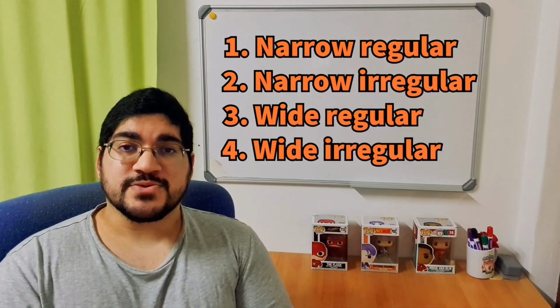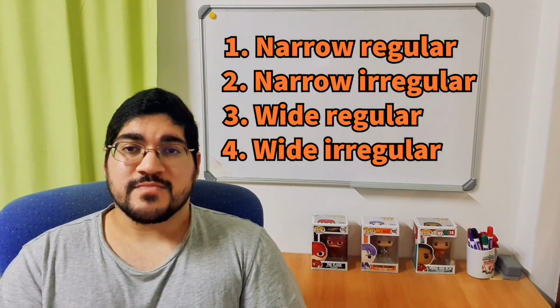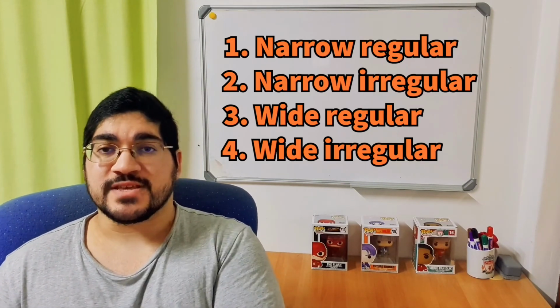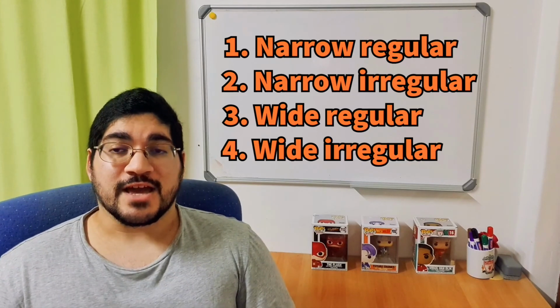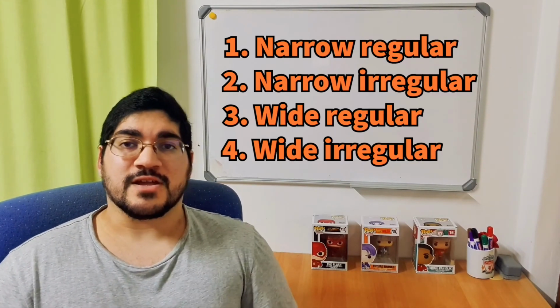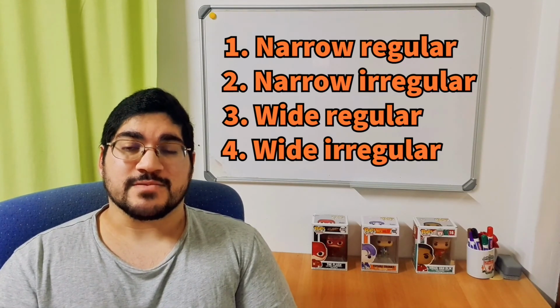And yeah, if you ask those two questions and you can answer those two questions, is it a regular or an irregular rhythm, and is it narrow or wide complex, you'll be able to figure out exactly which one of these 4 categories you need to look at. And once you know which category to look at, you'll know exactly what your diagnoses are, and you can make a judgment from there. Next time we're going to be talking about the QRS complex in more detail.